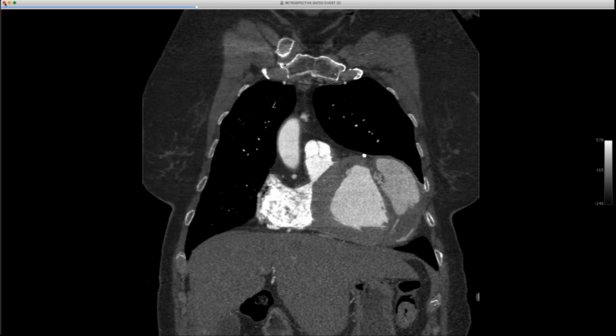So, Jeff, you think the VSD was infarct-induced? That's what I wonder, because it's not in the usual location of a perimembranous one. As Travis pointed out, it looks like a big patch down there, so it may have been a post-infarct one that they patched, and it broke down because of myocardial ischemia or myocardial death.